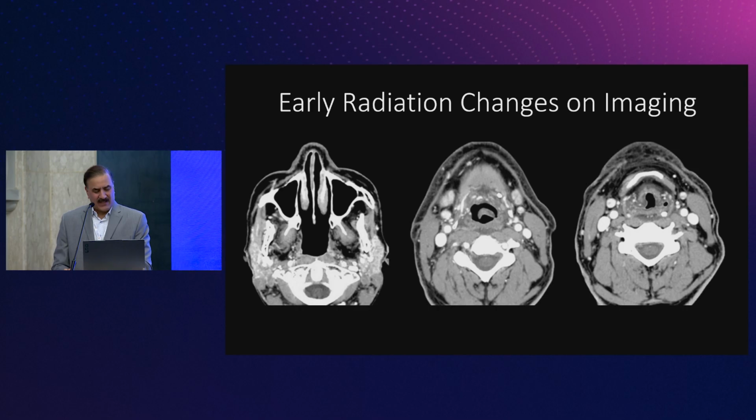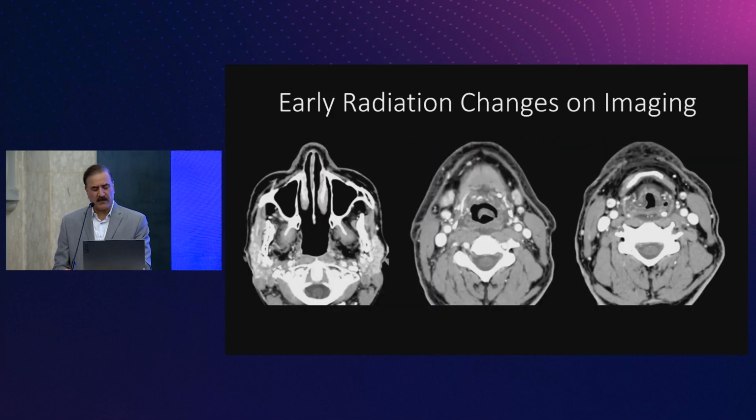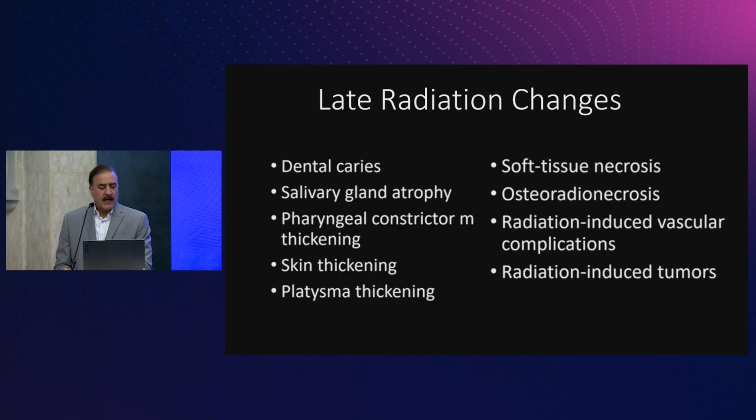So again, this is an enhancement of the gland itself, as you see. And you can also see some retropharyngeal edema also, and this is skin change, obvious to them. They don't need us for this.